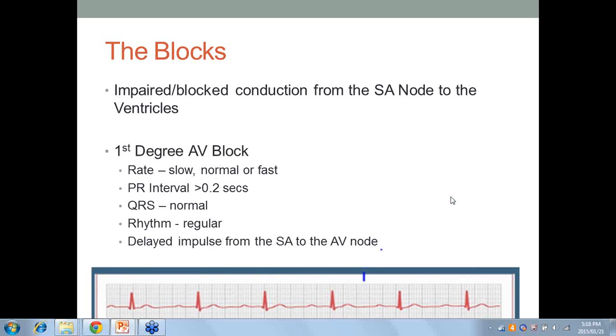Okay, so here is part 3 of the ECG Unit 7 ECG interpretation lecture. And so we're going to continue into some more ECG interpretation, and some of these can be a little tricky and then others a little easy, or rather easy.